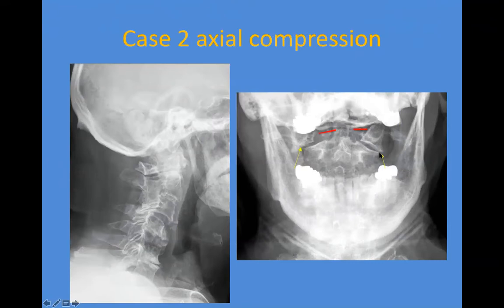See, what we're looking at here is that this outside cortex should be lined up. This lateral mass of C1 cortex should be lined up with the cortex of C2, but no, it's all the way over here. And you can also see this widening of this space from the odontoid process to the lateral mass. So we're looking at this and this is way too wide, and then this step off here, which is an abnormal offset.